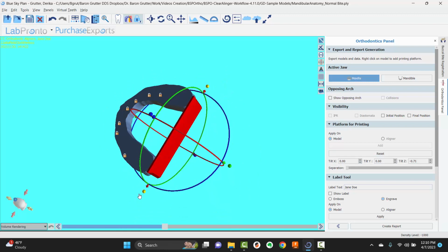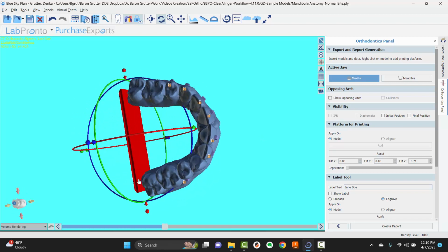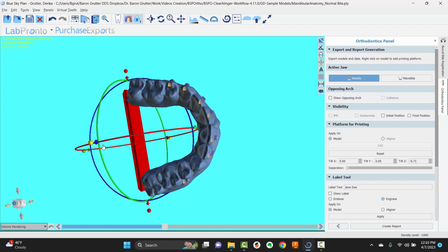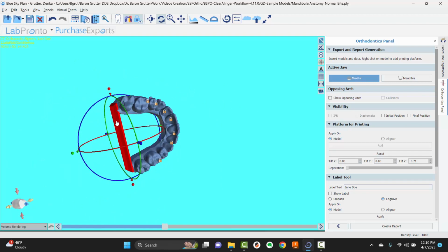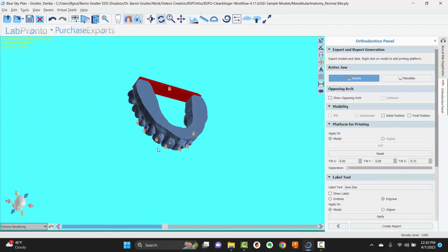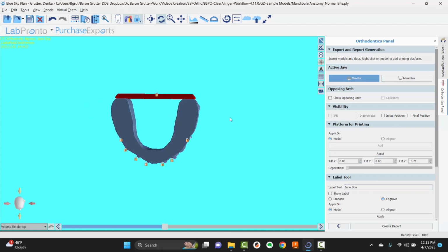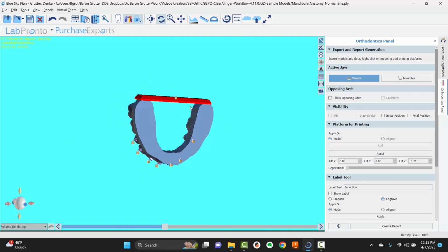And I'm just scaling it so that it's as wide as the heels there. And I don't need it any taller because this little part here doesn't serve a purpose. And there we go. So now when I print the models, I can go ahead and lock this. They'll be hanging upside down technically, but they'll be printing like this on the print bed. There's a slight overlap, a ledge there, whatever, it doesn't matter.